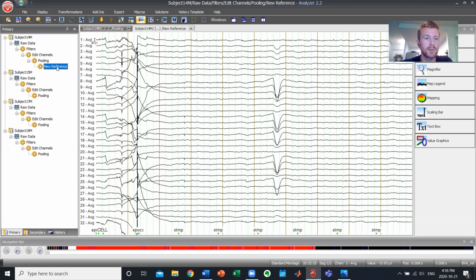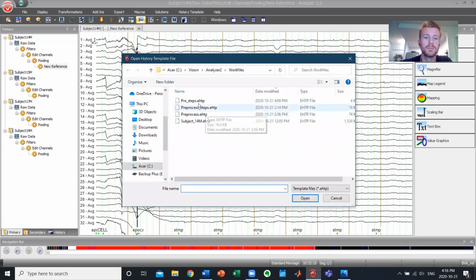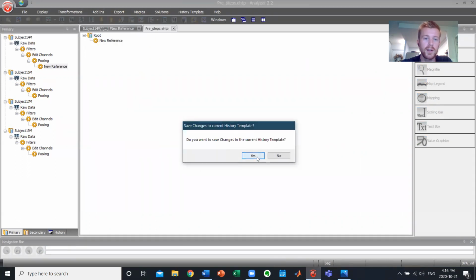So again, since this is one of those steps that I want to apply to everyone, I'm going to go to my history file. Process steps. And I'm going to apply new reference. Now, you could wait to apply this. I'm going to do it right now just because. So I'm going to apply to history file.